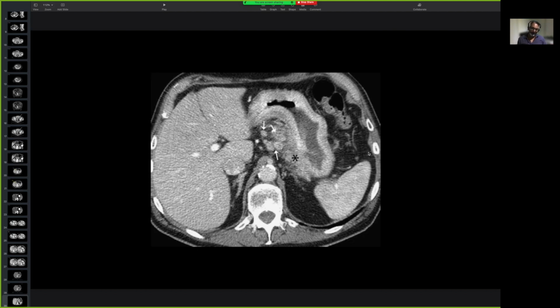Okay, now these are mesenteric lymph nodes. Again, that's the liver, that's the spleen. It's the aorta here. What is that? That's the stomach. And so these are gastrosplenic lymph nodes. I wonder why gastrosplenic should be here. These could also be called gastrohepatic. I think these are gastrohepatic lymph nodes. I think I got that wrong.